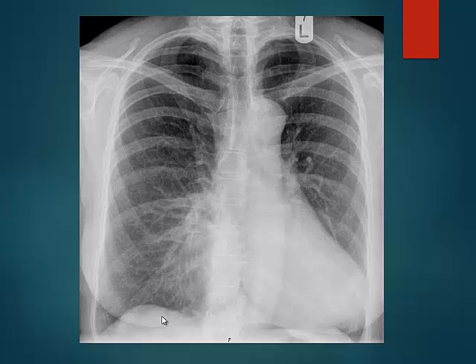Tubular shape of the heart. Why is that? Look at the ribs. We usually see patients with chronic pulmonary disease, COPD, etc., barrel-shaped chest. If you look at the anterior ribs here, they're very vertical. So this is pectus deformity. The features on chest X-ray are vertically oriented ribs, heart displaced to the left side, indistinct right cardiac border. To prove this, you do a lateral chest X-ray, or you see the patient, you will see the pectus deformity.